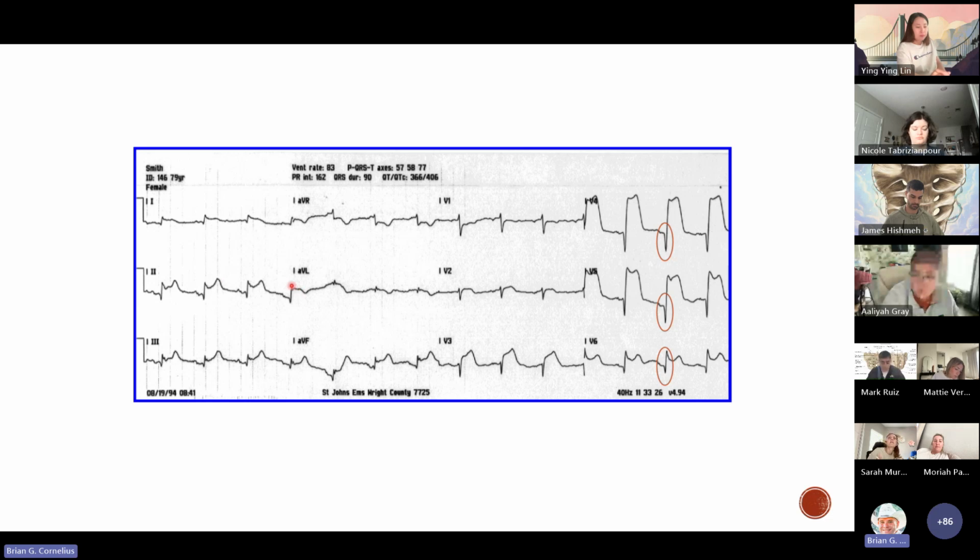So what I was saying as far as the system I use to do EKG interpretation, I start off looking at the boot. So if I were to draw a shoe here, I go around 2, I go around 3, kind of the bottom part of the boot here, and then I go around AVF, and that's my shoe. And shoes go on my feet, and my feet are at the bottom of my body. So inferior wall is where my boot is. That makes sense.